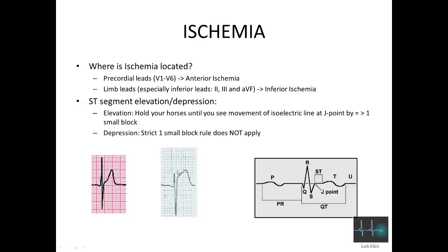So this is a significant finding, especially if we have this clinical picture of a patient having a heart attack, like clenching their fist over their sternum, cold sweating, pressure sensation, chest pain radiating down the left arm, and this on the ECG strip. You really want to get going with starting treatment, this MONA B protocol for infarcts.